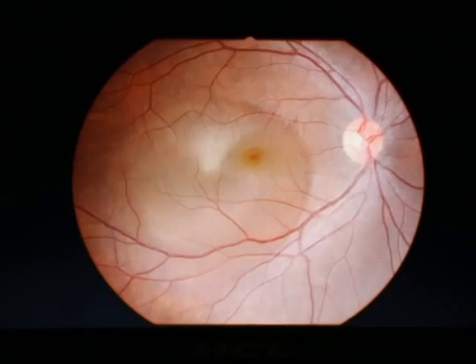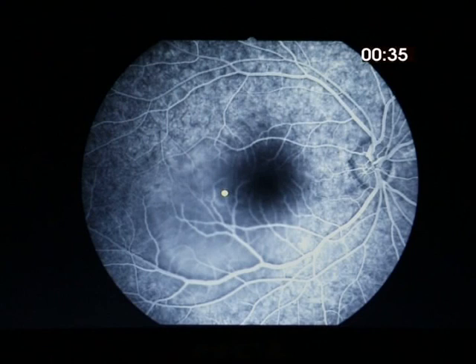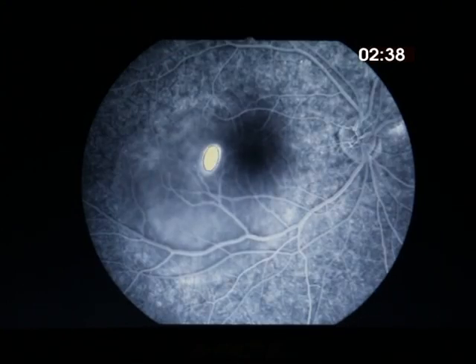When central serous retinopathy is to be treated with laser, the earliest FFA frames showing the leakage point is to be chosen and a light laser burn applied precisely over it, provided it is amenable to laser treatment. If a later frame is chosen, it leads to an unnecessarily large area of treatment with its attendant complications.